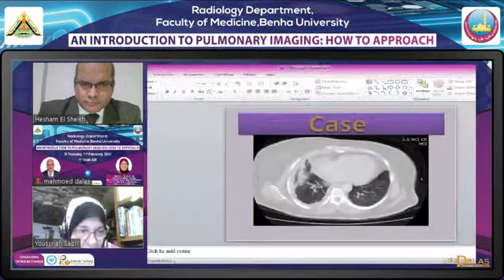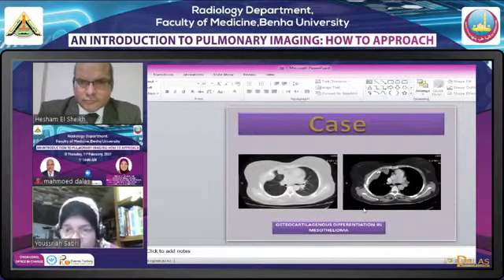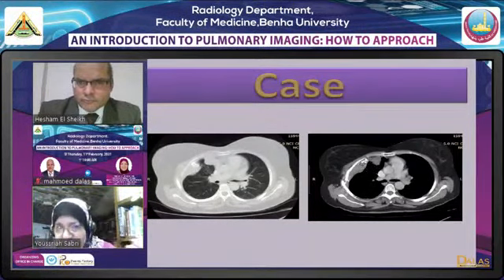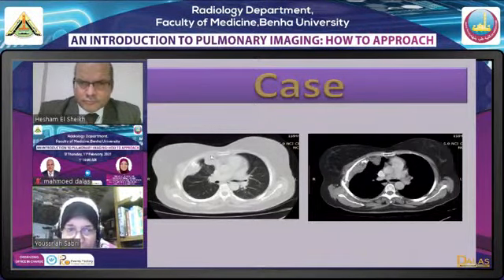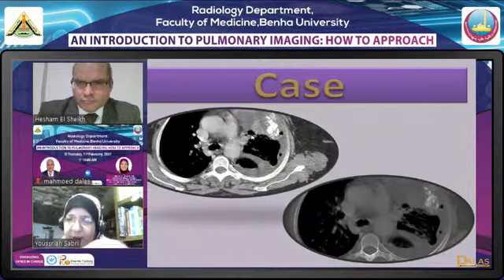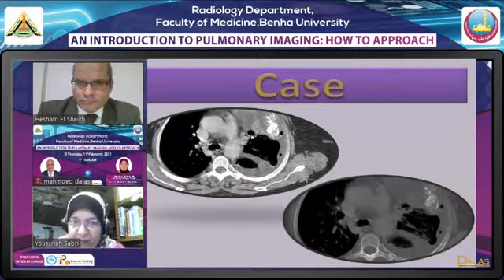الاوستيوكارتيلاجينس ديفرنشيشن. زي ما بقول لحضراتكم ان الكالسيفيكيشن هنا، هل ده دوت؟ لا، ده كونجلوميريت كالسيفيكيشن. ده كونجلوميريت كالسيفيكيشن، بوتشت كالسيفيكيشن محترمه موجوده اهو هنا في اللانج ويندو اوضح. كونجلوميريت كالسيفيكيشن موجود. اللي بعدها كونجلوميريت كالسيفيكيشن، ده مش لينير كالسيفيكيشن ولا دوت، موجوده بريفرال، ده كونجلوميريت كالسيفيكيشن.